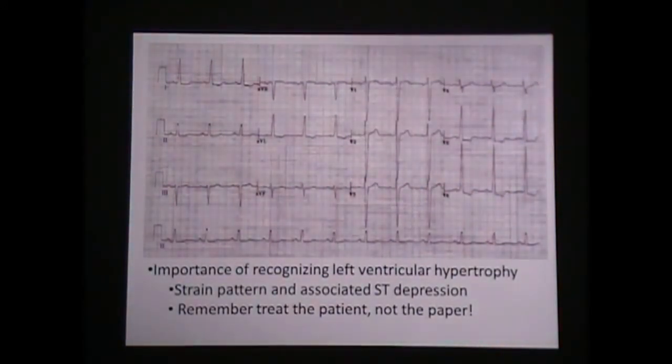But yeah, mainly he wanted me to have you guys recognize that pattern there. That is normal with LVH, and especially if you see that kind of wide P wave too, that kind of paints a whole picture.